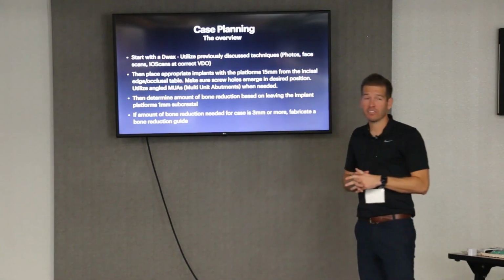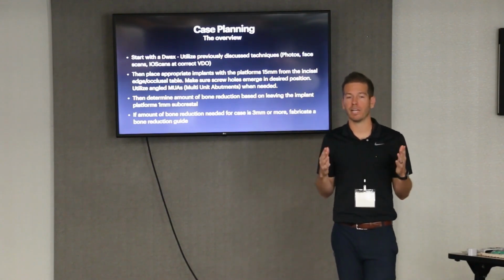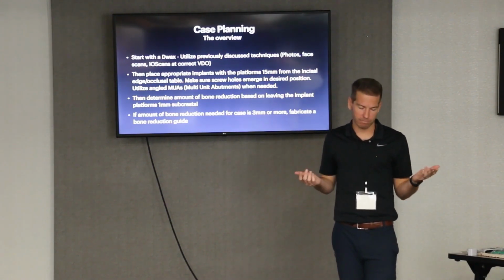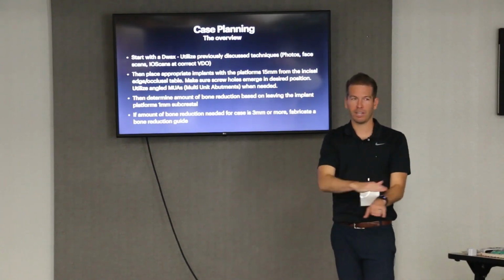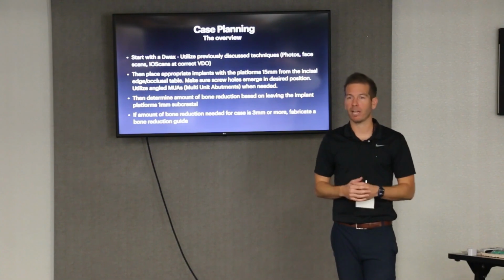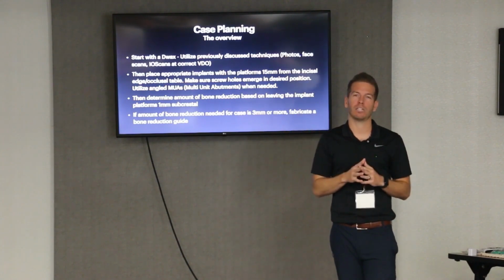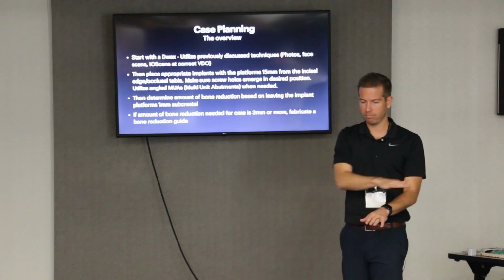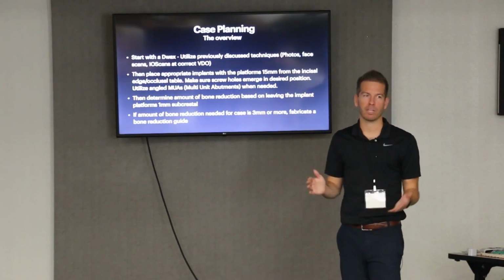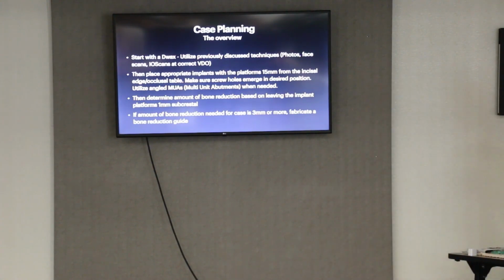It's also not too difficult. I've simplified things a little bit where you place those implants and then you go back to the case and say, okay, here's my implant. And you just start leveling bone down right to where you like your implants as far as depth in bone. So it's not too hard on simple cases to place those implants traditionally, and then go back and start taking down your bone until your implants are at the proper depth under the bone. So that's doable. You don't have to guide every little aspect all the time.